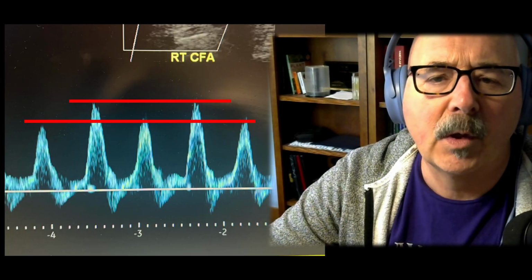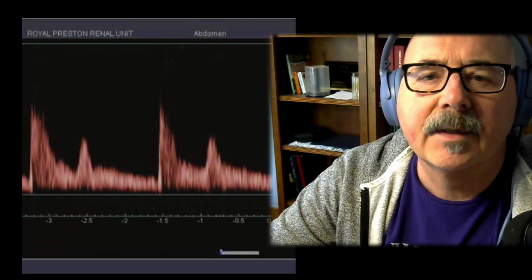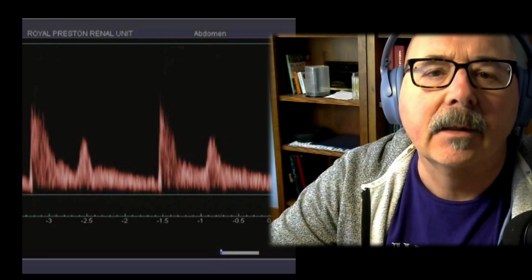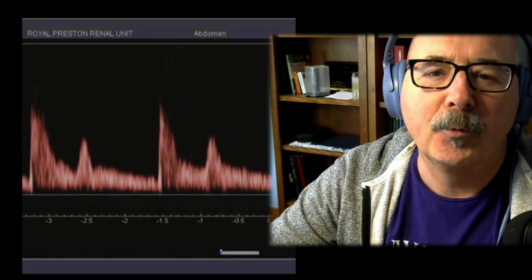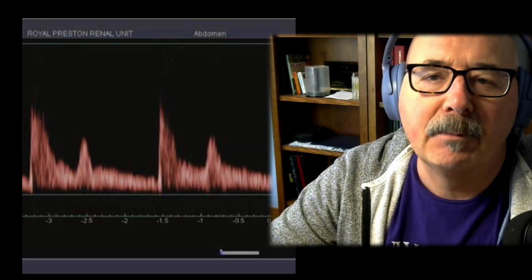The key feature of this waveform is the tracing of alternating velocities without a gap in time between the smaller ones and the larger ones. If there was a gap, such as in this waveform, I would be tempted to call it a run of bigeminy. And by the way, if you want to sound cool when you talk about cardiac rhythms, use the term run or salvo or burst to describe 3 or more sequential ectopic beats. Here is an example of a run of trigeminy with 3 beats followed by a slight pause.